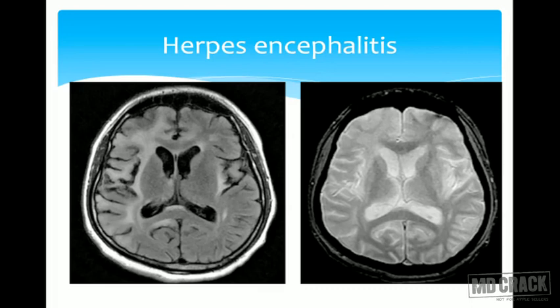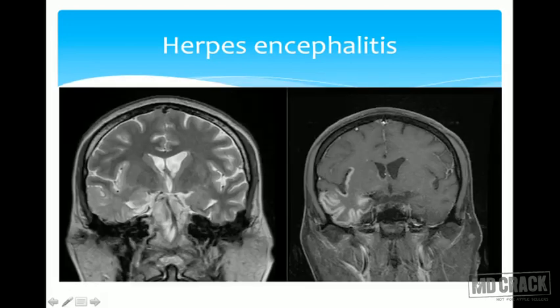the convulsions. This is another patient with herpes encephalitis. Over here, this is a FLAIR image, and this is a gradient image. What I'm trying to say is, look at the FLAIR image. Typically, this is a T2 weighted image with suppression of the CSF. That's why these white matter lesions stand out over here. It's easier to appreciate. And in herpes encephalitis, we take a gradient image because we want to rule out whether there's hemorrhage within the involved area or not.